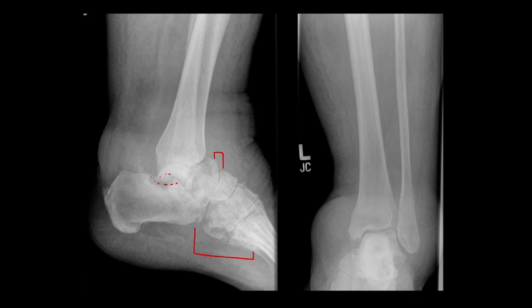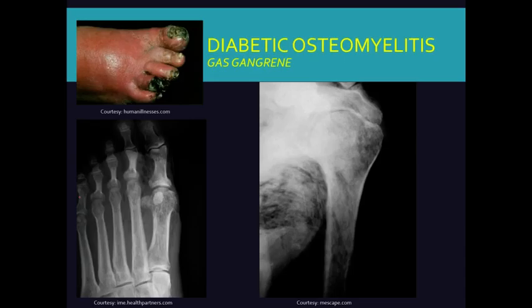So fifth metatarsal styloid process gone, cuboid fragmented. So likely a diabetic with a combination of septic arthritis, multiple areas, and or neuropathic arthropathy. The neuropathic arthropathy part you'll talk about with Dr. Peralt next semester. Again, I apologize for those that are squeamish, kind of gross.